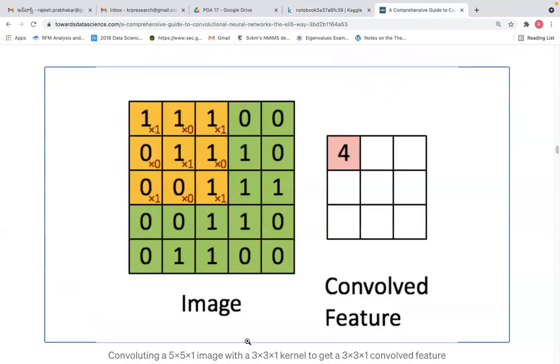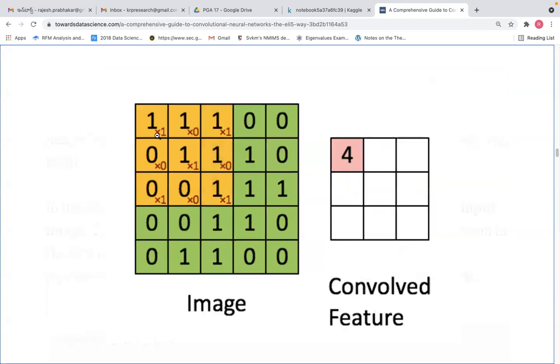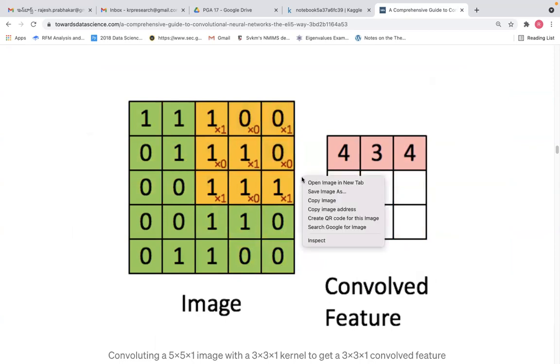So convolution is this, right? We have talked about this convolution yesterday. This is our pixel data. On this, one stride, one step it is running and calculating the values, using dot matrix calculation, 1 into 1. It calculates a convolution feature of a smaller dimension. The convolution will convert the image from a larger dimension to a smaller dimension.